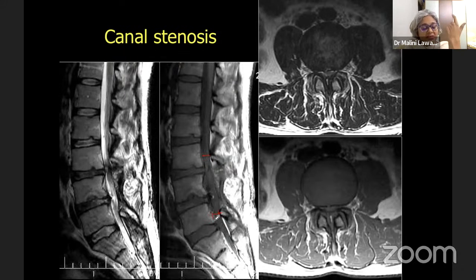And if this has not been mentioned or evaluated, and if a very minimally invasive surgery is done, then it is still possible that the stenosis may not be completely relieved. So here also, you can see an almost trifoliate-like narrow appearance of the canal. So even though surgery has been done, because of the developmental bony spinal canal narrowing, you may still be having symptoms.